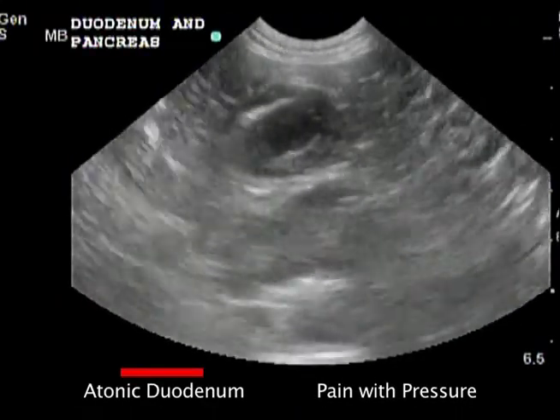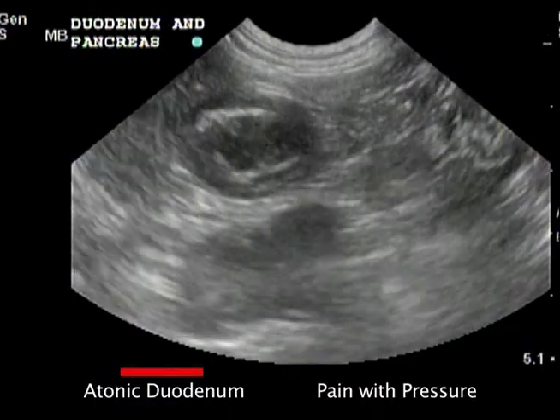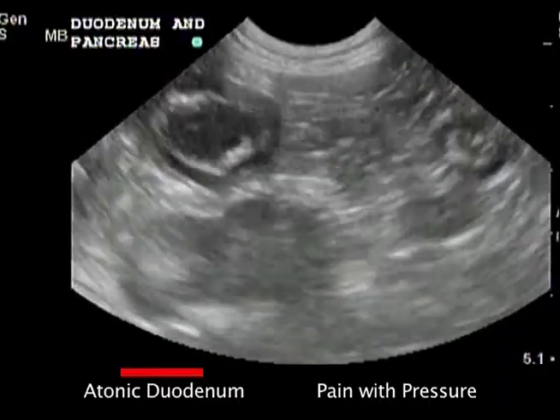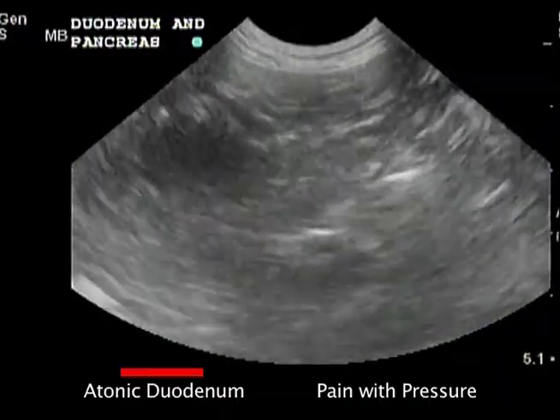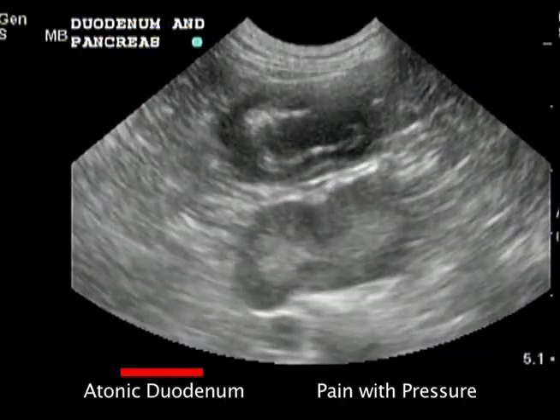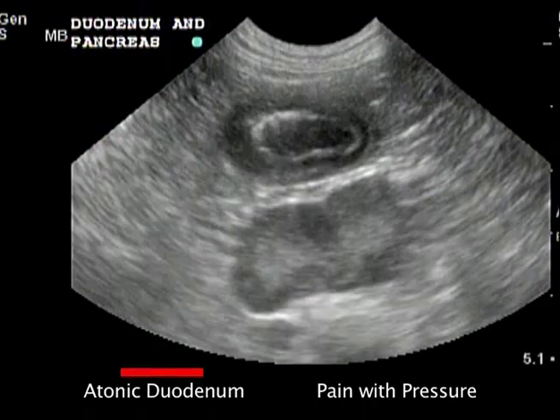Pancreatitis of the right limb of the pancreas can cause increased or decreased contractility of the duodenum. Sometimes a dilated and atonic duodenum will be the first lesion seen. Follow the duodenum distally to find a lesion of the pancreas as shown here.